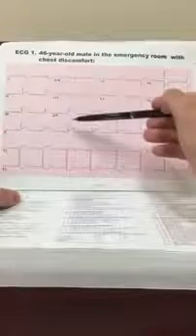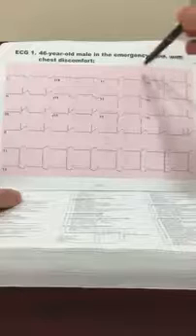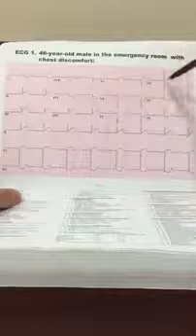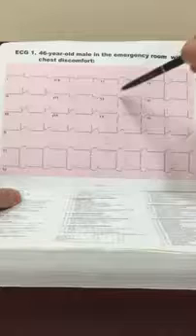And once again, we found that in leads 2, 3, and AVF, indicative of an inferior wall MI, and also T wave abnormalities in V1 elevation, possible anterior wall, anterior septal, and then the V2, 3, and 4 could be due to ischemia, as indicated by the depressions of the ST segments here, here, and here.